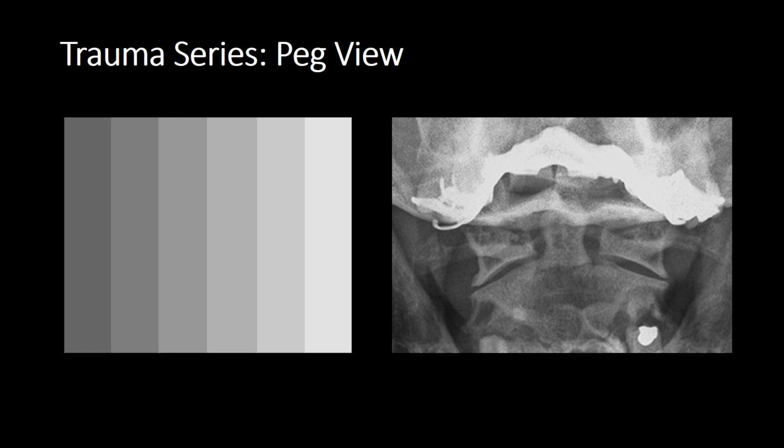So Mach effects are frequently caused by the posterior arch of C1, by the incisors, the occiput, and any number of things. So look very carefully to see if it's caused by an overlapping structure. Incidentally, please remove dentures when you do cervical spine x-rays. They create an awful lot of artifact and reduce diagnostic accuracy.